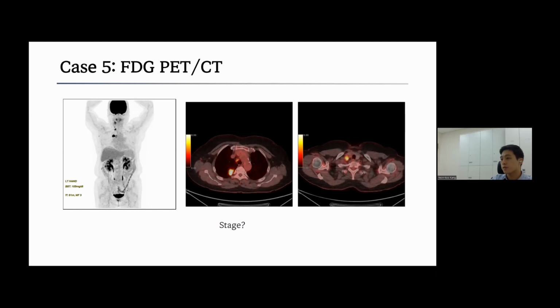Supraclavicular lymph node metastasis is suspected, and the stage is T1b N3 M0. So percutaneous biopsy for 1R lymph nodes pathologically confirmed metastatic adenocarcinoma. So CCRT was planned for this patient.